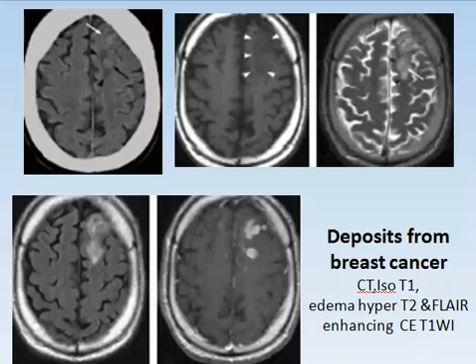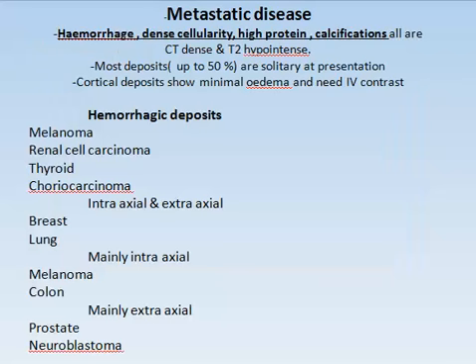Deposits from breast cancer, again we said that breast cancer can show intra-axial or extra-axial, and the lung the same.